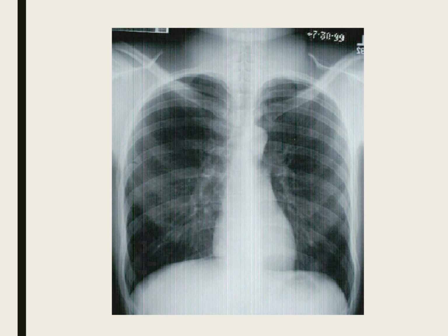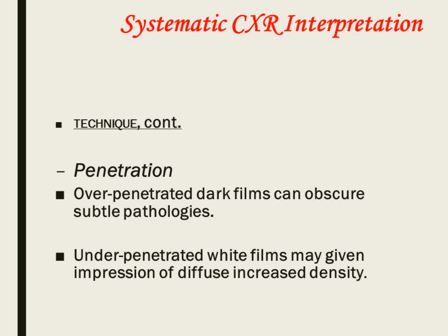Oh, sorry, I was going to talk about penetration. That's another thing. So now with digital imaging, penetration can be slightly adjusted, right? X-rays that are overexposed and underexposed can be manually adjusted. I can do it with a mouse. 5-10 years ago, you couldn't do that. You had a plastic film sitting on a view box, and that's what you have.